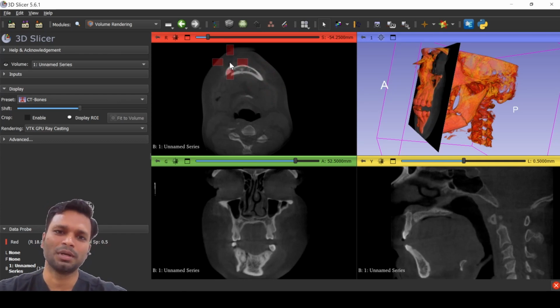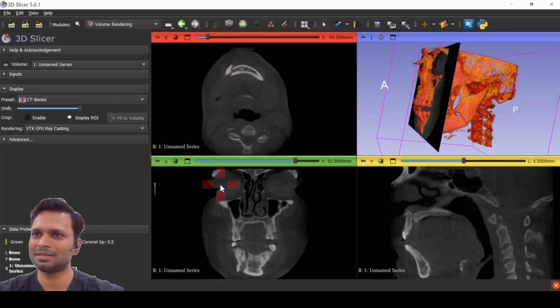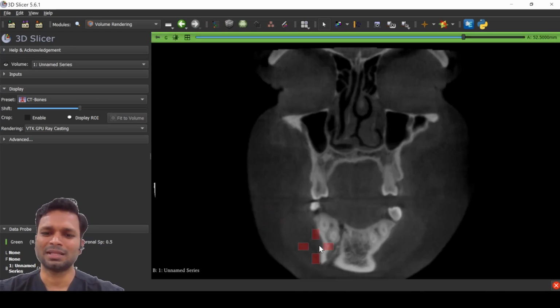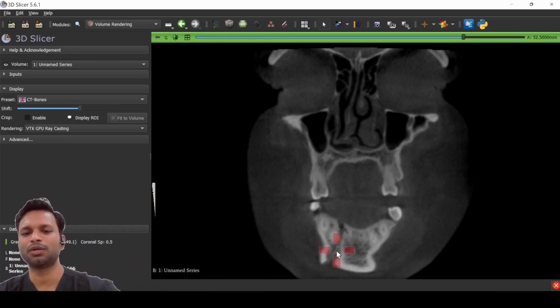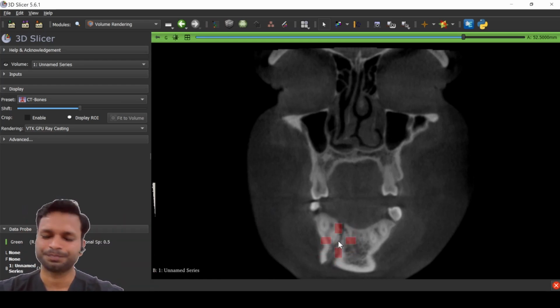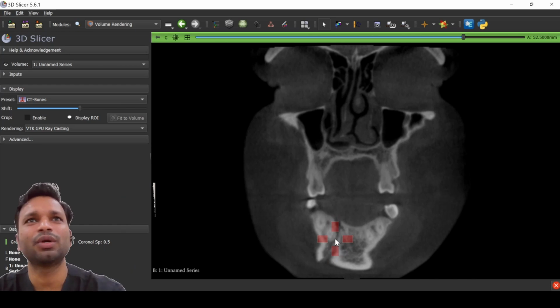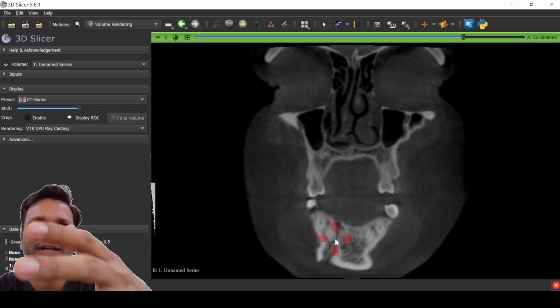The most commonly used one is the axial slice because it shows the whole arch. Can you see? Okay. It is not that clear in this because you already knew there's a fracture. You were able to locate it easily. Okay. So look at all the slices together, one by one, and then you can correlate which one shows what defect and where.